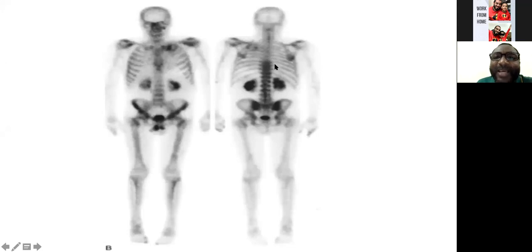So what has happened here is that this patient, usually if they have some form of therapy, radiotherapy, sometimes you have patients who would present with reduced uptake following radiotherapy. So this patient had some radiotherapy to his primary lesion. That's why you are not properly visualizing the upper part of the spine. But I'm very happy that you identified those lesions. Beautiful. Thank you, Doctor.